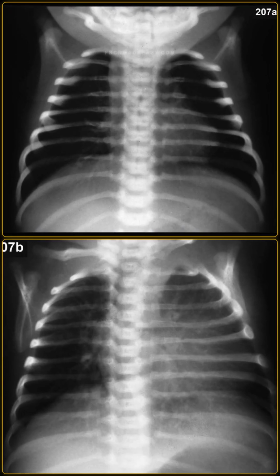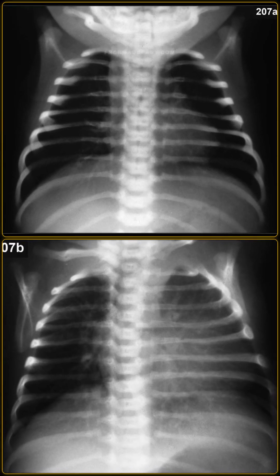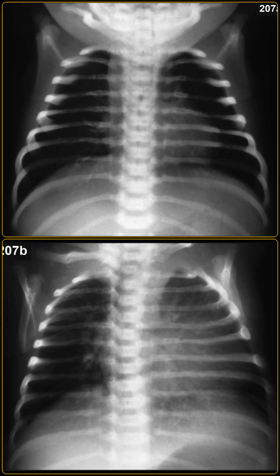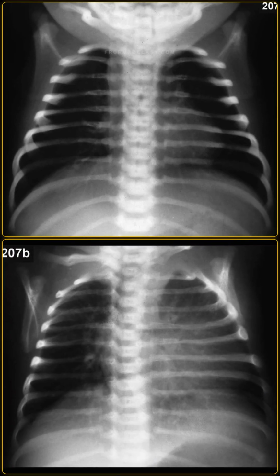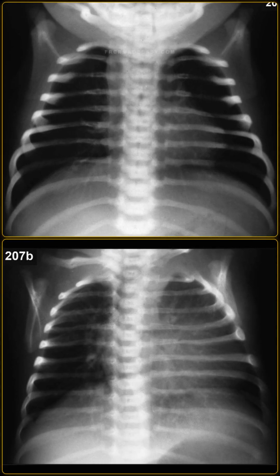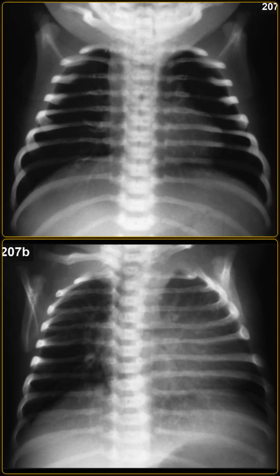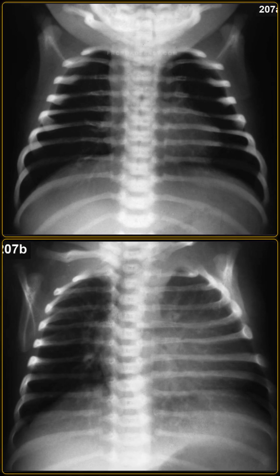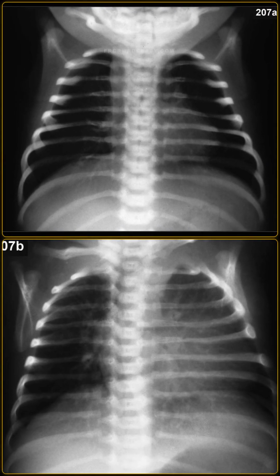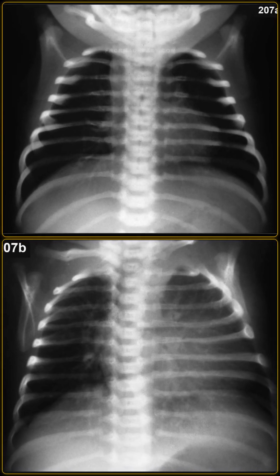How would you manage the patient with Tetralogy of Fallot as a radiologist? As a radiologist, I would urgently communicate these findings to the referring pediatric team. I would recommend a formal diagnostic echocardiogram to evaluate the precise degree of right ventricular outflow tract obstruction and measure the ventricular septal defect. I would monitor the chest radiographs for any signs of developing heart failure or progressive hypoxia. Finally, I would ensure the patient is referred immediately to pediatric cardiology and cardiothoracic surgery for definitive surgical repair.